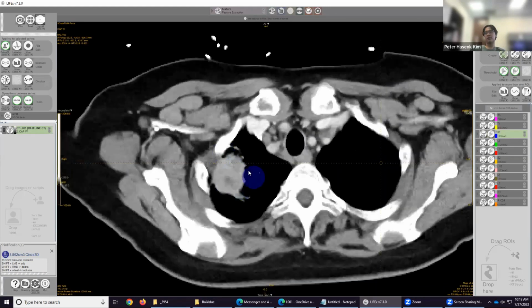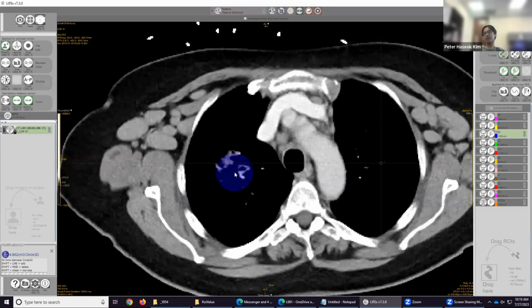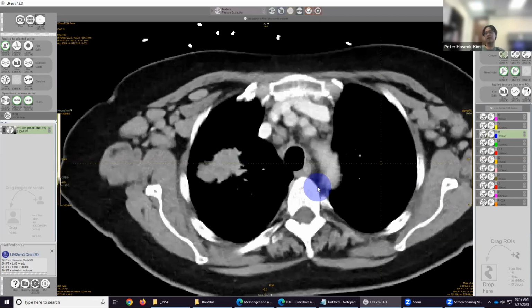But yeah, for the tumor, the end function will clear out most of it, but you still have to go in and manually check slide by slide to see, okay, did it really exclude all of it? Since we set the range to -50 to 300, if something is 300.4, very close to our margin, then the machine's just going to include it. And so we want to manually exclude everything that looks like a blood vessel or whatever, to improve accuracy for our findings. I think that is all.